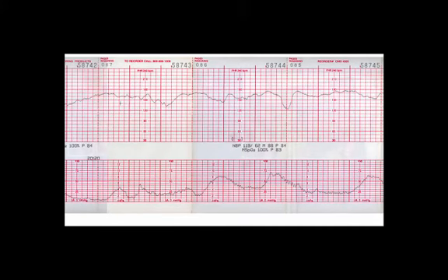We can see that this fetal heart rate doesn't really have an area where it rests very well. It's more difficult to determine what the baseline would be on this fetal heart rate. This is a more advanced strip to look at. So I'm showing you mostly because I want you to see some of these different concepts that give you information about how a baby may differ based on the fetal heart rate. This would be called a wandering baseline, meaning I can't tell where the baseline is.